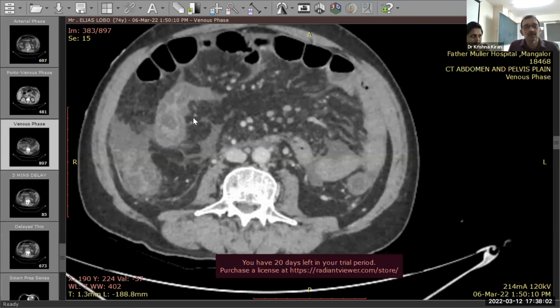Okay. So all the findings are there. So what is the final diagnosis that you can give? Considering the heterogeneous pattern of cirrhosis and raised AFP, the heterogeneous appearing liver and the arterially enhancing portal vein thrombus, the most likely diagnosis would be infiltrative HCC with signs of portal hypertension like collaterals and portal colopathy. Yeah. So remember that a large HCC may not follow the rules. That I would say is the message in this case.